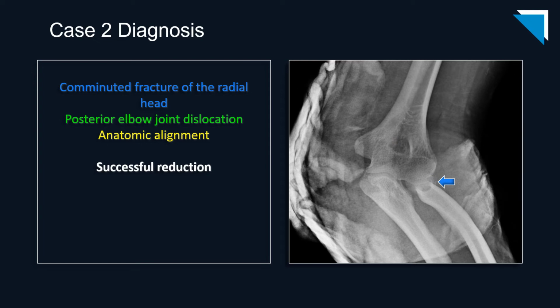And we can even see a portion of the radial head fracture on this oblique view. I wanted to show this study because we all, myself included, have a tendency to turn off a bit when we see that a study is degraded either by motion or some other artifact. And in fact, there's lots we can tell from even these markedly limited studies. This one's not so marked.